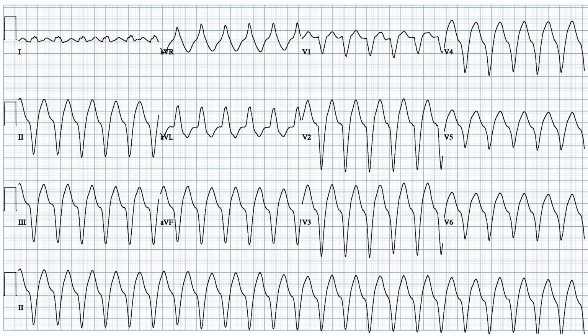And this is the last example of this session. In this particular case, this is a wide complex tachycardia with the usual differential diagnosis list. If we're down to VT and SVT with aberrancy, I can't see any P waves here, so I can't use any AV association or dissociation criteria, and I don't have initiation or termination. So we're really stuck with QRS morphology, which, as you know, is probabilistic.